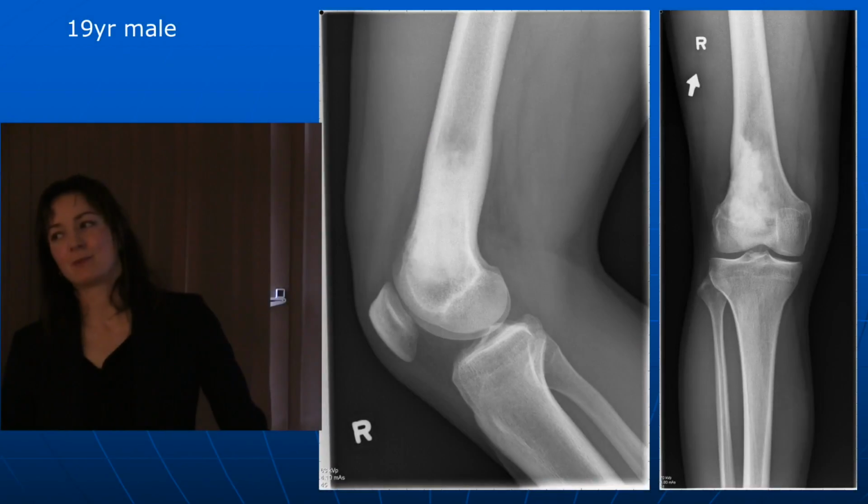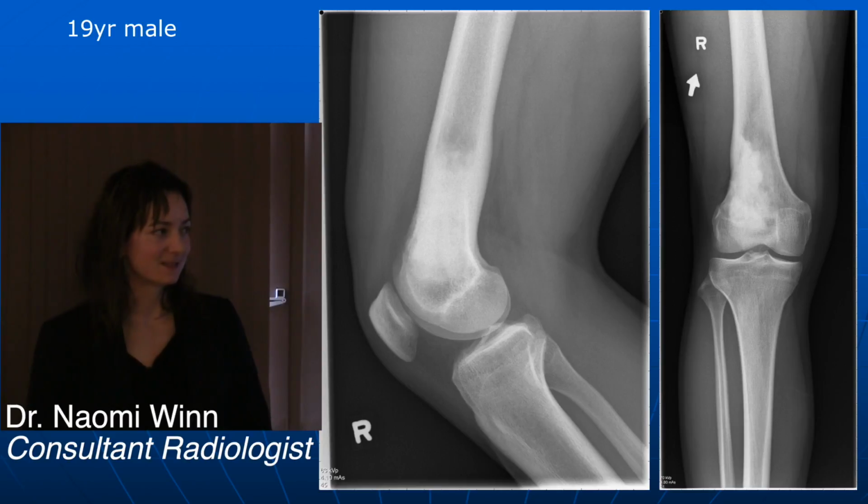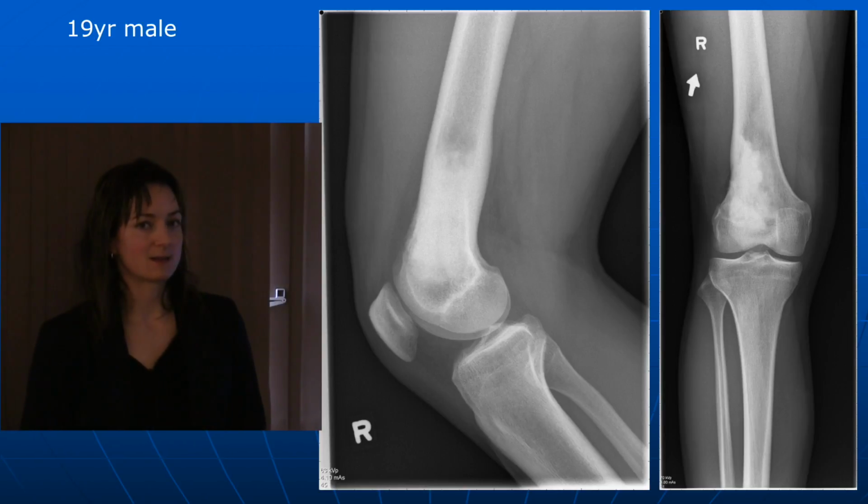So this is a very important case. This is when you have to recognise, have a good look at this case. So we've got a 19-year-old patient. There's definitely a lesion there. Try and decide aggressive or not.